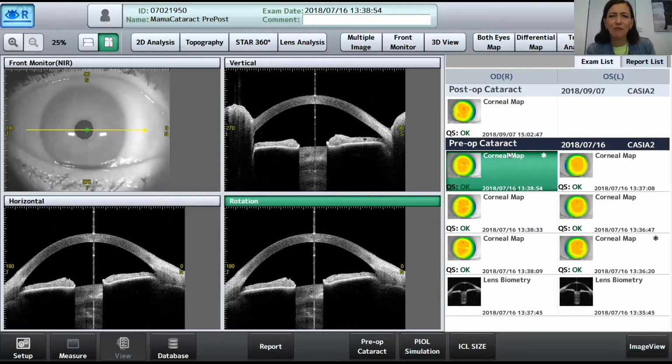You know that we have plenty of options in the CASIA2, almost too many options you might think. It's true, but we want it because every single doctor has a different way of using the CASIA and a different expectation. Because of this, I think it is very important to make the software as flexible as possible and also to give you as many possibilities as possible.